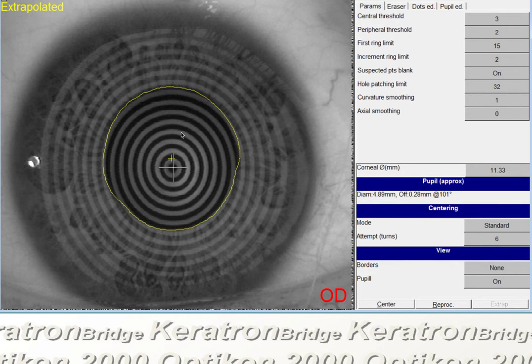Because this map was already used to design some lenses, the way to edit the map without overriding any previous data is to simply rename this patient in your sidebar. You can just tag it with a -1 or whatever designation you like.